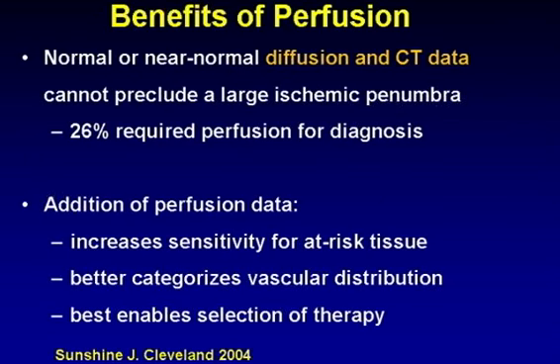What are the benefits of doing perfusion? If you're thinking about doing perfusion on top of your non-contrast CT, well, a lot of the time, as you'll see, and a lot of you will know, the non-contrast CT will be normal. But then, what really is going on? Is the patient really having a stroke, or is there really a large stroke that's occurring? So I think that doing perfusion, and we'll show you our protocol for CT perfusion and CTA, really demonstrates to you what the extent of tissue at risk is really going to be, and what the vascular distribution is. So I think the feeling is that it does really enable more optimal selection of therapy.